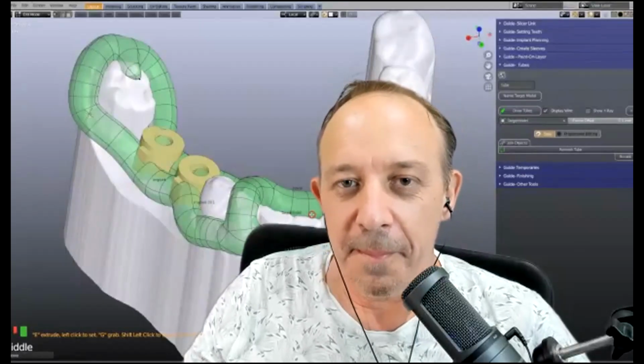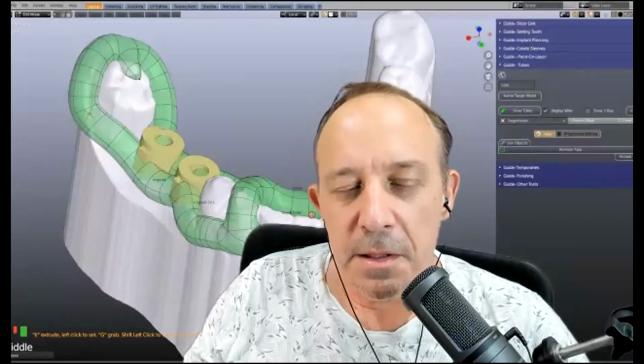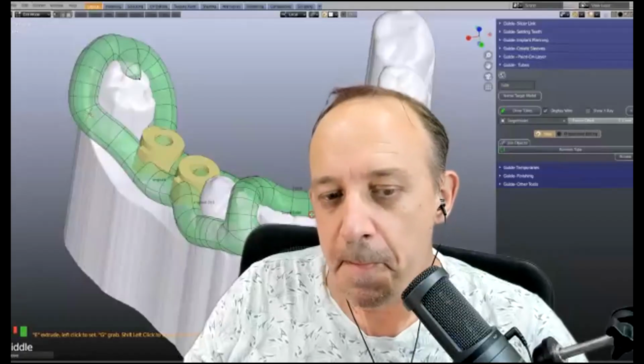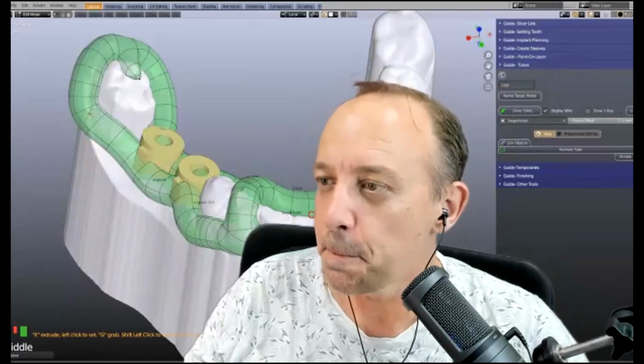Okay. So it was a quick session. How long did that take? Twenty minutes or something? Nearly 25 minutes. So without talking, it doesn't take long to make a bridge. And it follows a kind of logic sequence. I think within 10 minutes, you would be able to make this bridge. Maybe even faster, if you know what you're doing.